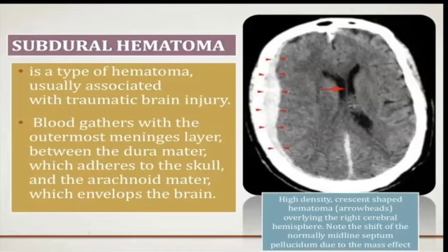However, sometimes we could get a subdural hematoma that's surrounding the tentorium. Now, that would look something like a fork here at the posterior part of the brain. So if you see a white structure on a CT that looks like a fork at the posterior part of the brain, then you should also be thinking this patient has some sort of subdural hematoma.